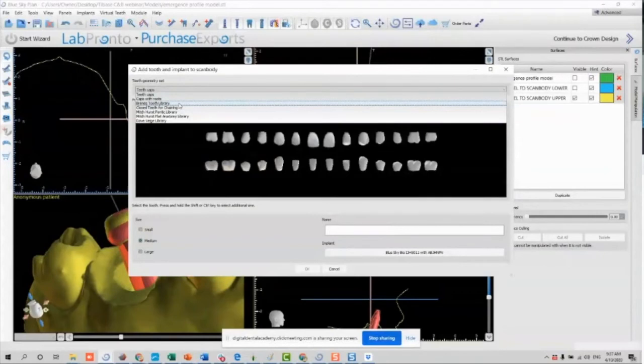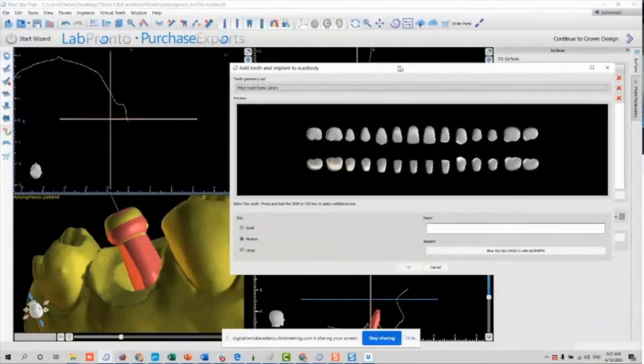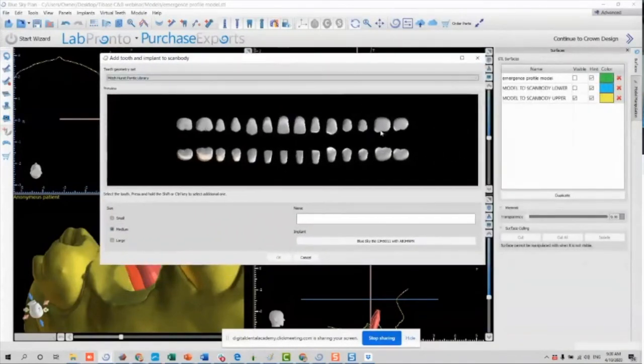This is how all what David presented yesterday on the surgical guide presentation now makes sense, because this is a real crown down approach where you not only are bringing a wax up, but also you're bringing the real restoration to the game. So here, I will just select, let's say the Davids, let's say the Mitchhurst. Okay, so I'm going to select the Mitchhurst library, and here I will select, this is a left maxillary molar.